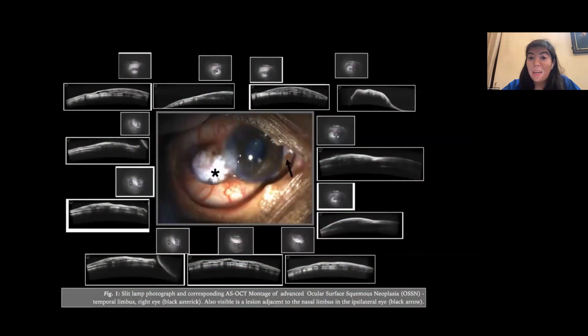On anterior segment OCT, I've been able to actually create an anterior segment montage. And you know, in the retina field, how much we love our retinal montage to be able to identify the different locations. This is not something that has been published yet, but something that we do hope to publish in the near future is this idea that we can create a cross-sectional aspect on every slice and every corner of the lesion in question.